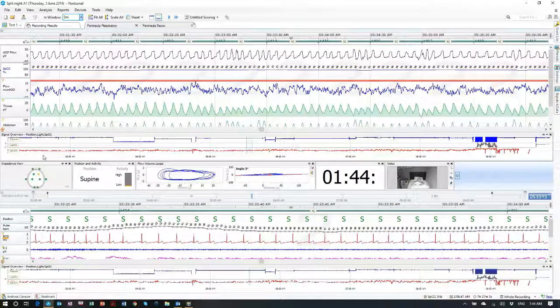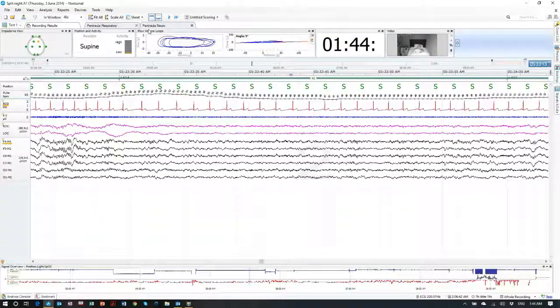Okay, so let's have a look here also. What else can we show you? Combining sheets, banners, running reports. By the way, to separate these two sheets, we literally pull those two apart.